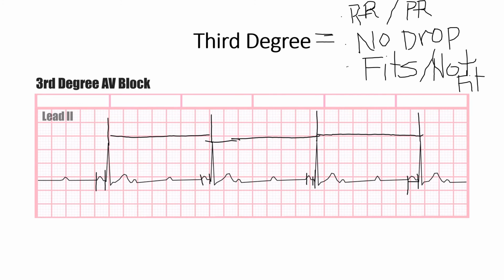It doesn't matter, because the only difference is first degree, where it does not drop and it does not fit. First degree is always no drop, no fit. Third degree, if you find one that fits, that's how you know you're in a third degree, because it did not drop and it did not fit. So I hope this is not screwing you guys up.